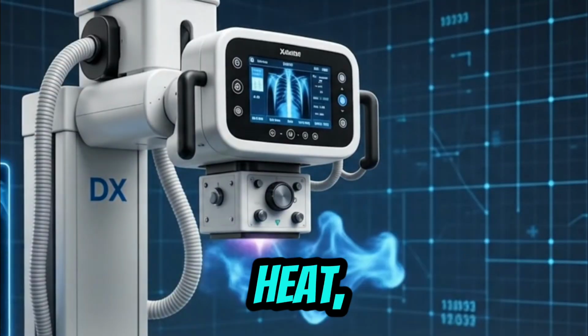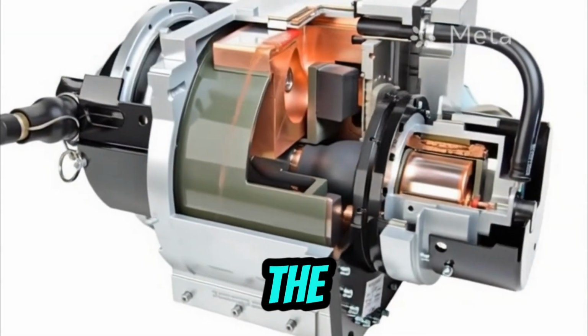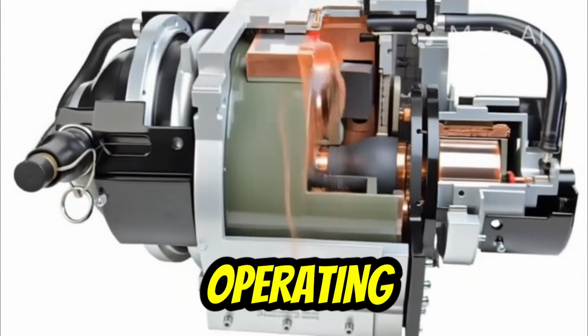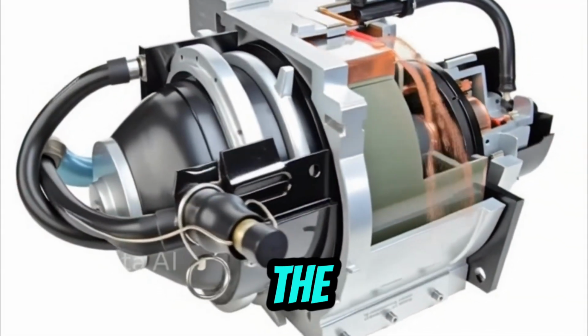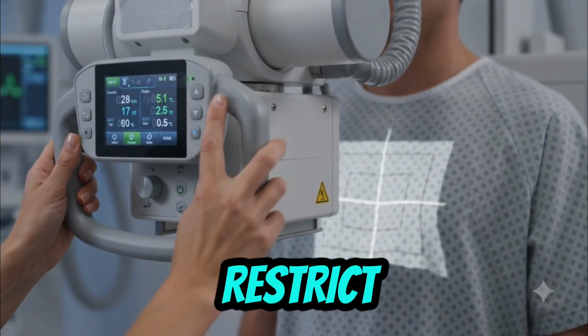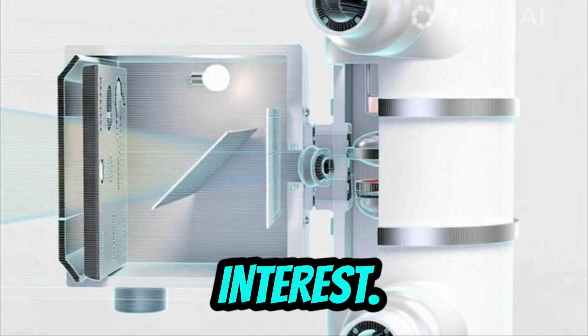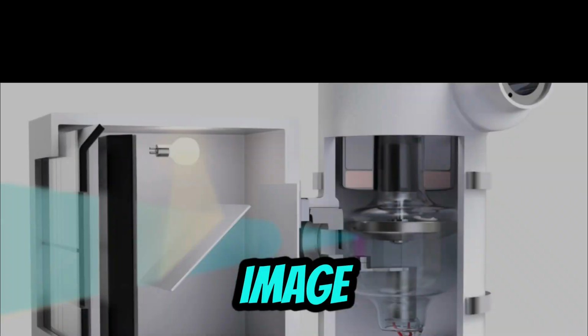To manage this heat, the X-ray tube is surrounded by insulating oil, which helps cool the tube and maintain safe operating temperatures. The generated X-rays exit the tube and pass through the collimator. The collimator contains adjustable lead shutters that restrict the X-ray beam to the area of interest. This reduces unnecessary radiation exposure and improves image quality.